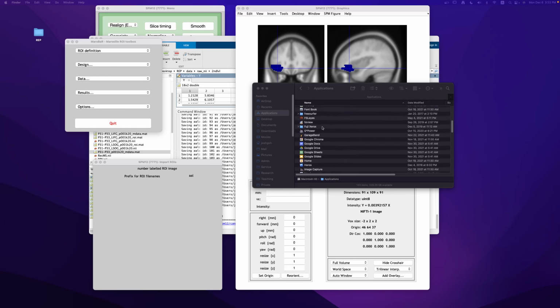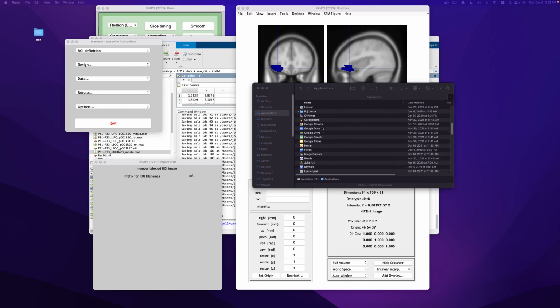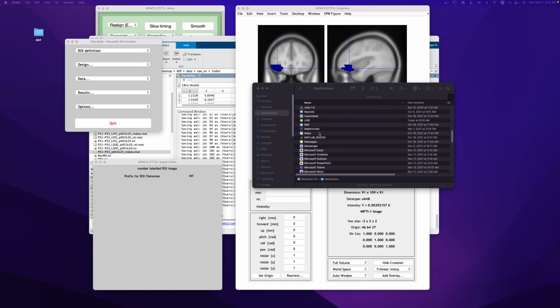Now, you already have this template if you've downloaded MRIcron, but it's in a format that doesn't really allow you at the moment to use specific anatomical regions as ROIs. In order for you to do that, you're going to have to do a little bit of tweaking.